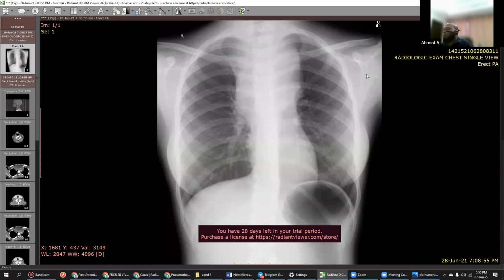Can you re-describe the mass again? Because this is a very classic film. You have to be on the spot to get even a 6. That's how it's very important. It is all grading based, so you have to describe it very nicely. Just think for 15 seconds and describe to me very nicely this one.